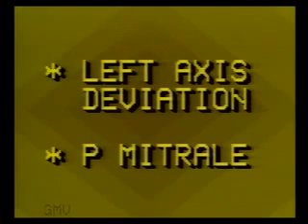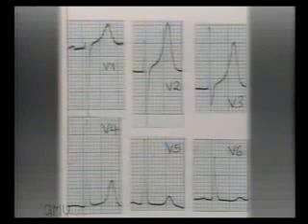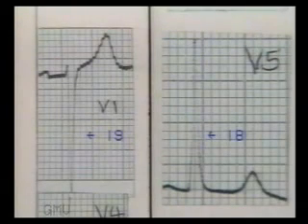It will usually be associated with left axis deviation, and a P mitrale of left atrial hypertrophy may be seen in lead 2. In this ECG, there is a normal pattern of QRS complexes from negative in V1 to positive in V6. So let us measure SV1 and RV5 from the isoelectric line. SV1 is 19 millimeters and RV5 is 18 millimeters. SV1 plus RV5 is 37 millimeters, that is more than 35 millimeters. So left ventricular hypertrophy is present.